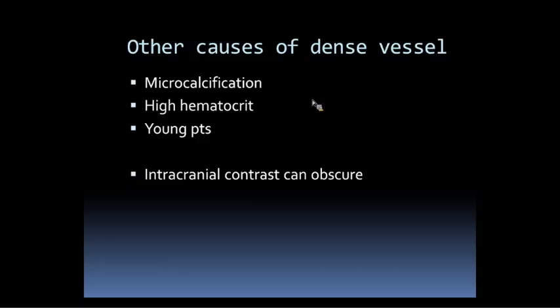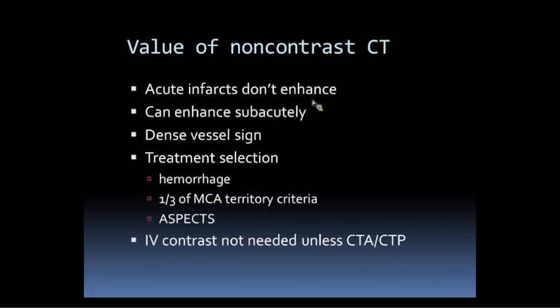And this is great for looking for dense vessels. So you look at those and you can really see that, okay, this is clearly much different than the other ones, and it's clearly not calcium as much as we can tell. Sometimes with microcalcifications you can't really tell, but if it's a coarser or macrocalcification, you can tell on the thin images. So those are extremely helpful in looking for dense vessels.